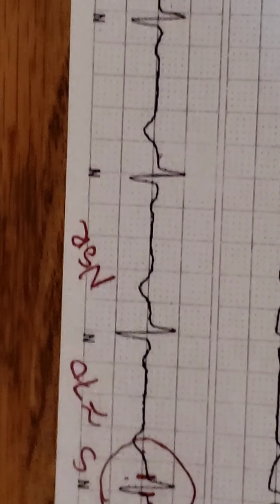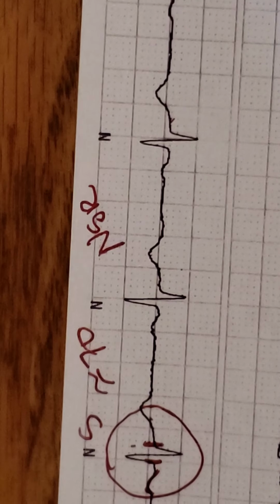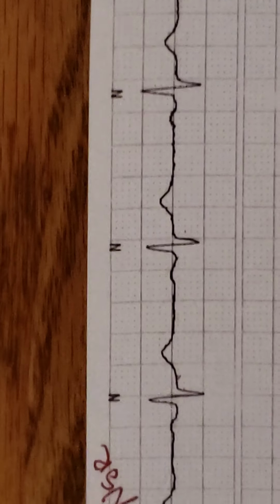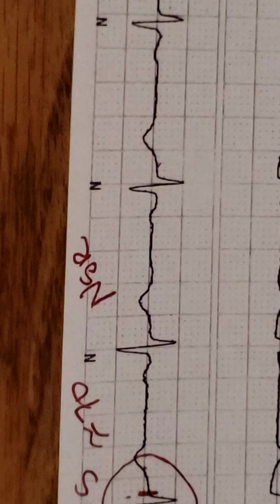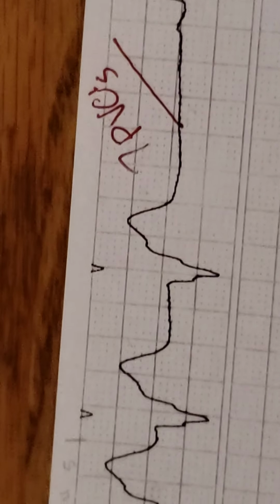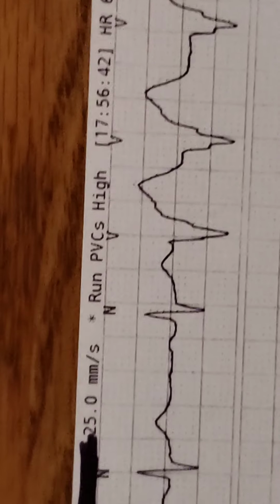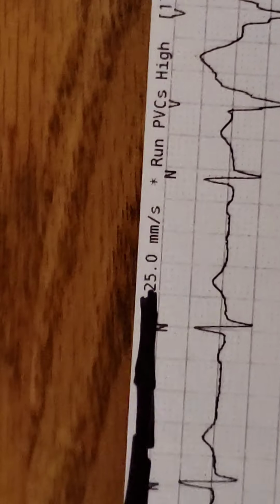This is a patient who was in a nice normal sinus rhythm, right? We can see a P, a QRS, followed by a T. It's kind of a slow rate though, right? I mean, doesn't look too fast, maybe like 60, 70. But then earlier at the beginning of this strip, we had all these crazy PVCs, right? There were 7 of them back to back, but they're all the same shape.